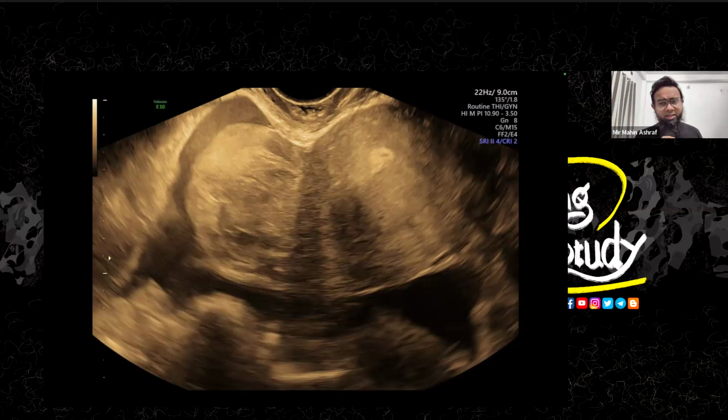In oophoritis, the vascularity gets very high. In case of torsion, you'll get a good vascularity at the surrounding part, but the vascular resistance is quite high. Oophoritis has inflammation, so the flow will show you a good diastolic component.